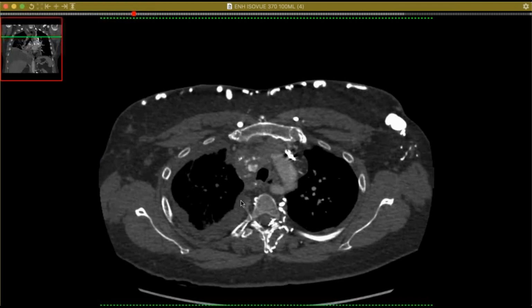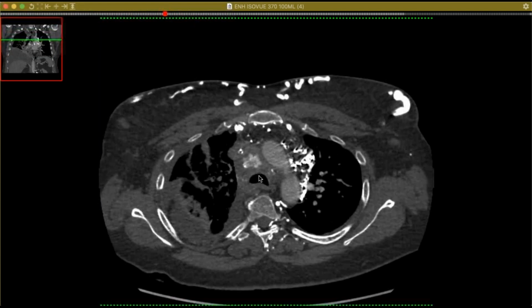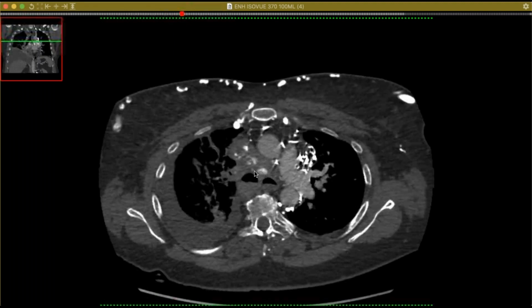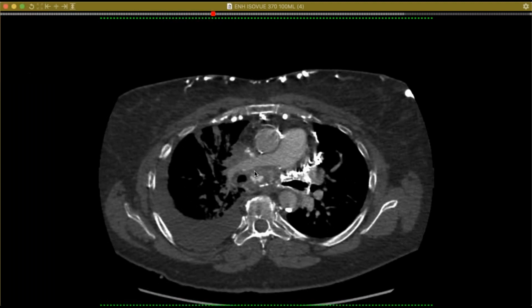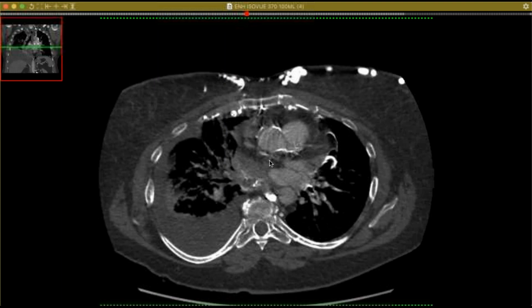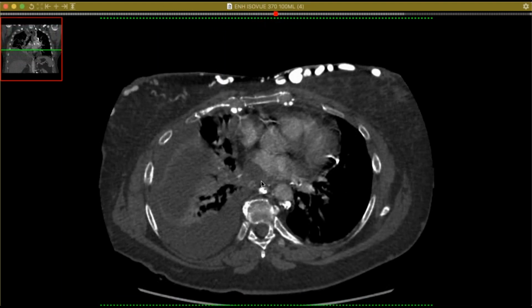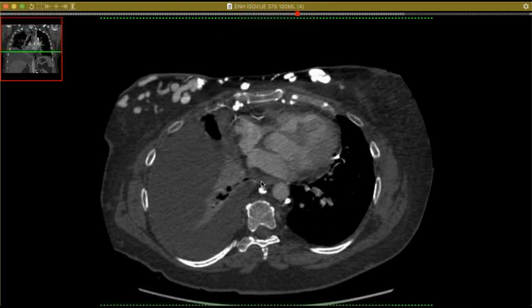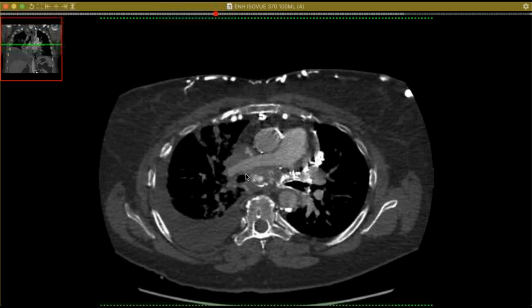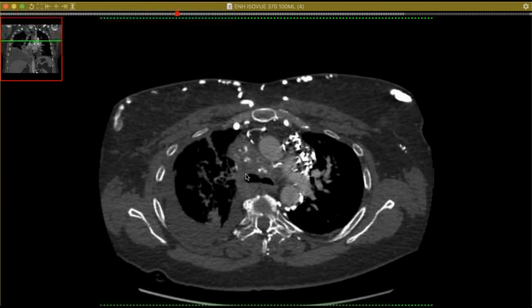We see this effusion. And then in the mediastinum, there's this mass with some dense material in it, and a lot of collateral vessels here. The pulmonary artery is open, but if we go down to the pulmonary veins, the inferior pulmonary vein is quite narrow. There's a little sliver of it maybe coming down right there. And then the superior pulmonary vein is mostly out. And then again, the SVC, of course, is really nowhere to be seen.